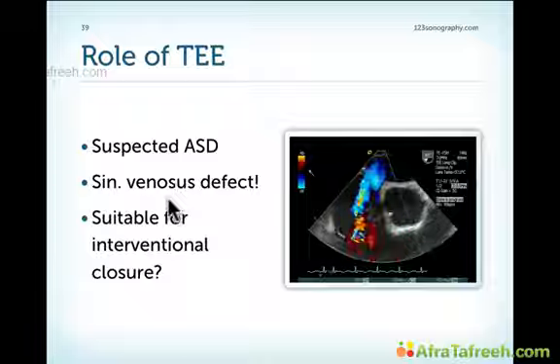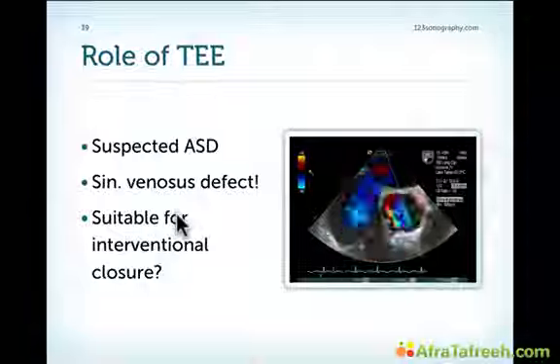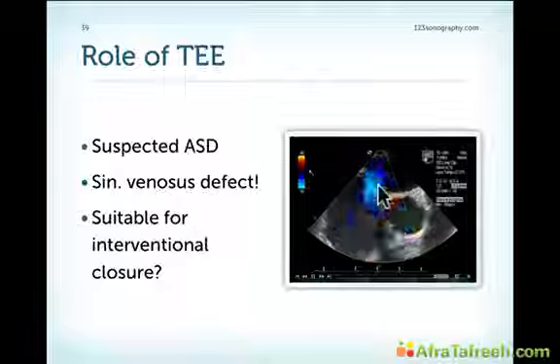A very important role of TEE, of course, is when it comes to the question whether a defect is suitable for catheter intervention. Again, the size of the defect is critical here, and we will see more details about this evaluation later.